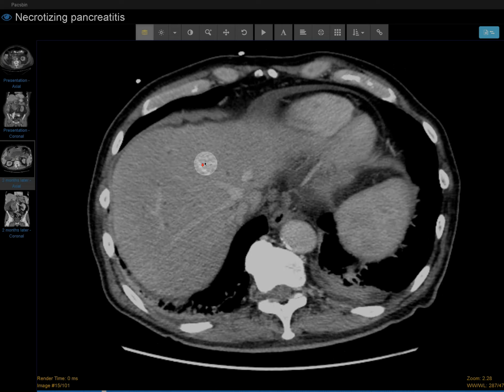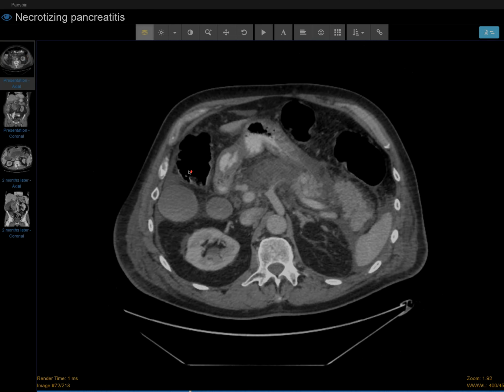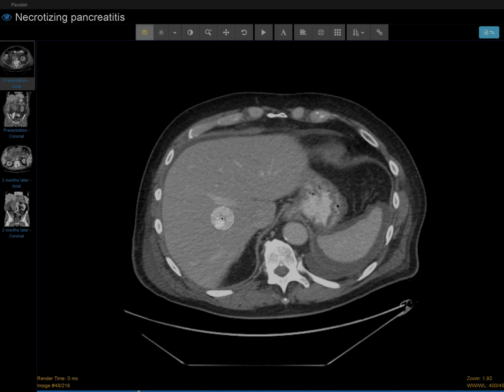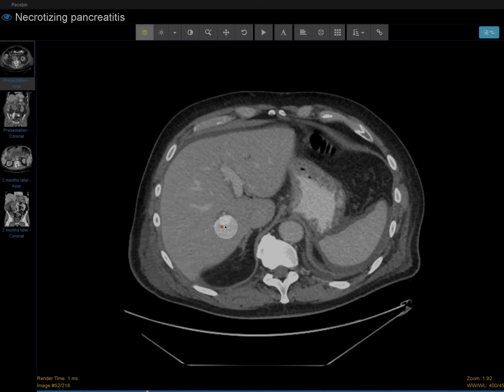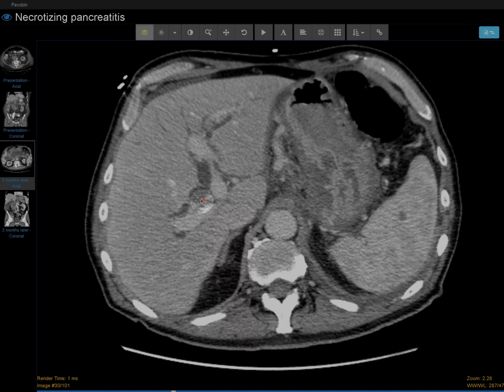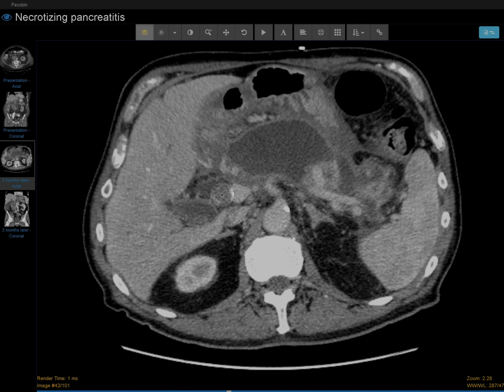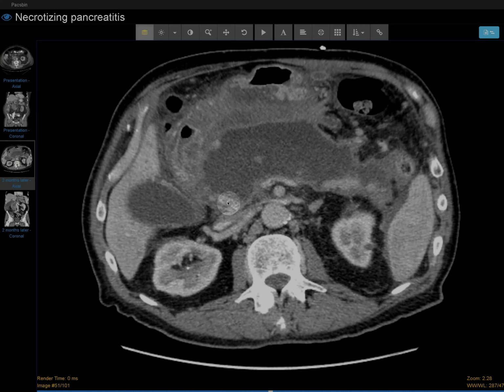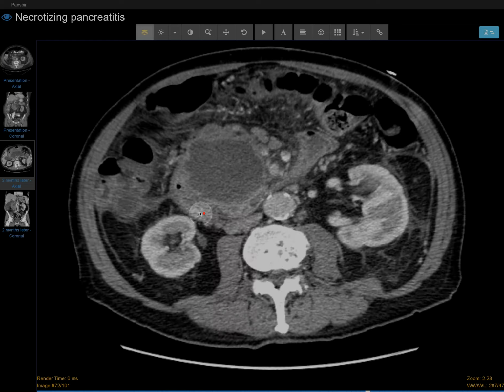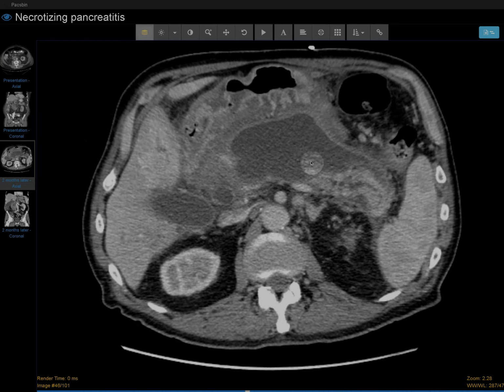And if I scroll down, the intrahepatic bile ducts are dilated abnormally. That's compared to here. There may have been some mild dilatation of the bile ducts. This low density stuff you see are the bile ducts, like right around here. This is much more prominent 2 months later. The gallbladder is still here. The extrahepatic bile ducts are really dilated too, and it's really narrowed down as it goes closer to the duodenum. And there's this big fluid collection.